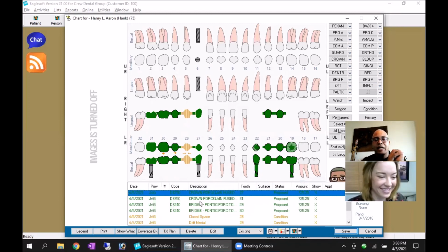Yeah. And like I said, there's so much that you can do and so much you can see, but the biggest issue is don't think that this is going to be exactly anatomical. Just think you really want to be able to look at it and say, oh, that's what's going on, and then be able to dig a little deeper. The picture should tell you that there's something to look for there, and then be able to dig a little deeper to find out what's happening.